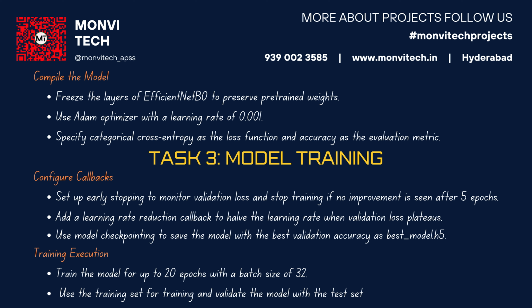Callbacks. 1. Set up early stopping to monitor validation loss and stop training if no improvement is seen after 5 epochs. 2. Add a learning rate reduction callback to halve the learning rate when validation loss plateaus. 3. Use model checkpointing to save the model with the best validation accuracy as bestmodel.h5. Training execution. 1. Train the model for up to 20 epochs with a batch size of 32. 2. Use the training set for training and validate the model with the test set.